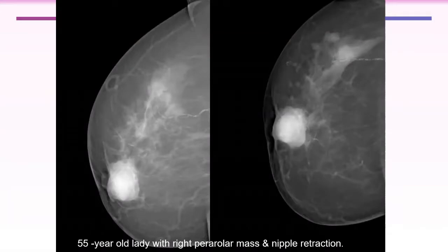So if you have a suspicious mass and you have other nodules, how can you explain these other small masses? So maybe multiple cysts. I need to do ultrasound for her. Yes, maybe. What is your differential diagnosis in this case?